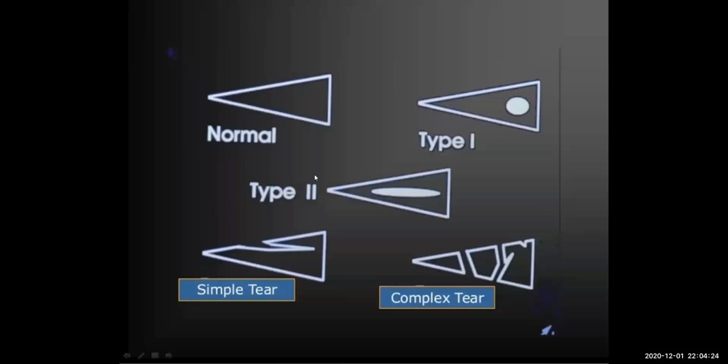So these are the types of the tears, described based on the MRI, on whether there is some change in the signal inside, or according to the line of the tear. We agreed that the meniscus should be a good homogeneous triangle, complete, with no single defect and no disruption of one of the borders of the triangle. It should be contained and homogeneously black.